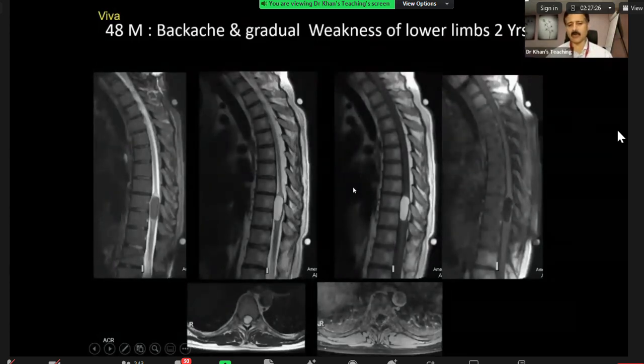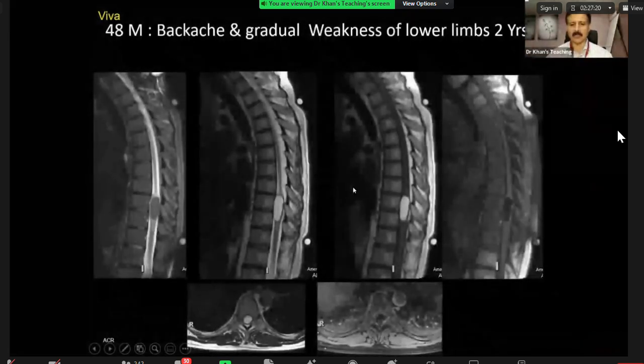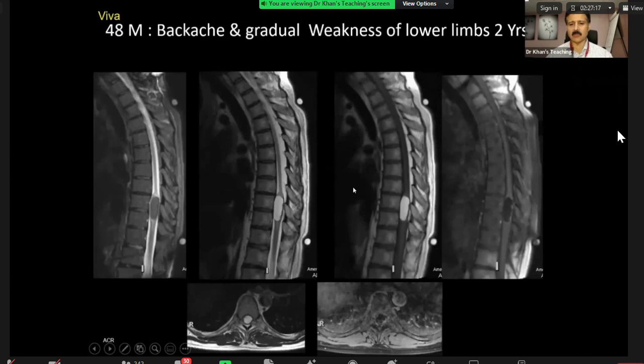This case is from the American College of Radiology, and the irony is that they operated on it, and this is a biopsy proven lipoma. So radiologically speaking, when you see fat, look at other signal. A lipoma will suppress completely, but a dermoid, histology wise, has got various components. There will be something other than fat inside a dermoid. So that is how you discriminate radiologically speaking, right? So this is complete fat, and so this is a lipoma.